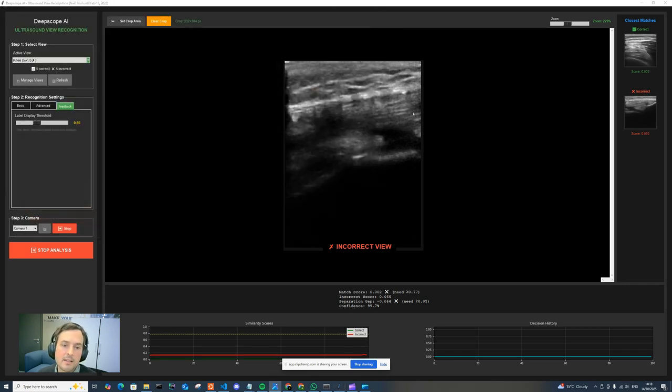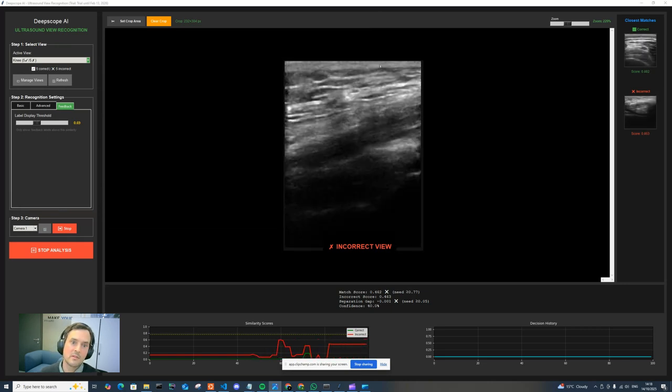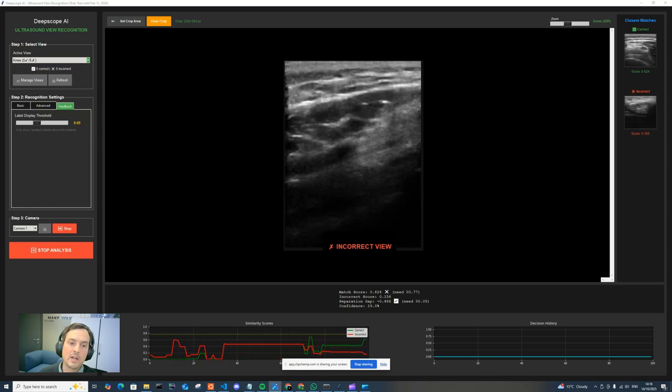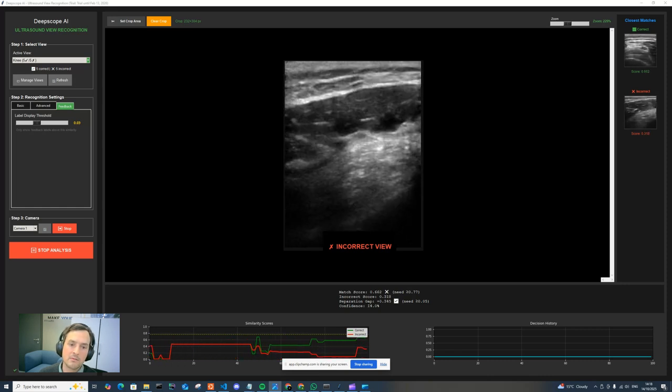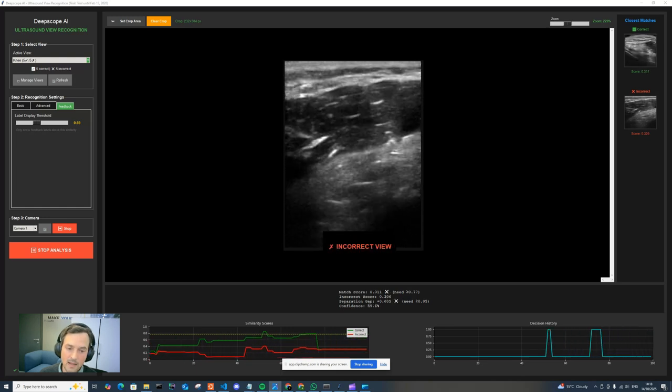So yeah, that is the AI system. We're going to add lots of new things into this, but this is the first example of it. And the cool thing is that if you add a few examples, it will just run using your laptop continuously. It will get a little bit hot, and otherwise it will just run using your NVIDIA GPU.